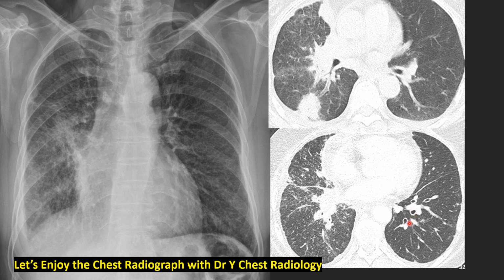This is normal bronchus size and clean lung zone. Also have some metastatic lesions here too. And there are many micronodules, prominent core, and pleural tiny micronodules, thickened major fissure, thickened interlobular septum. This is lymphangitic metastasis findings.